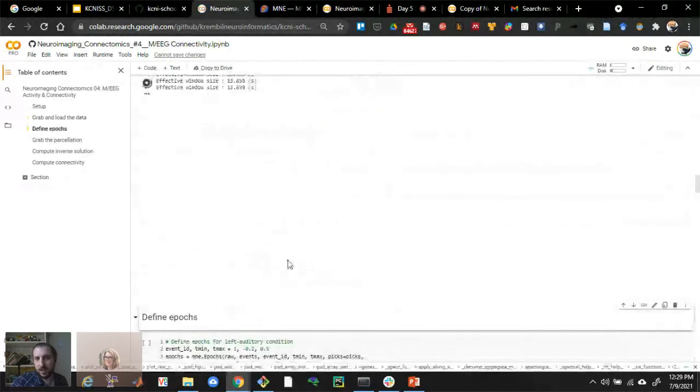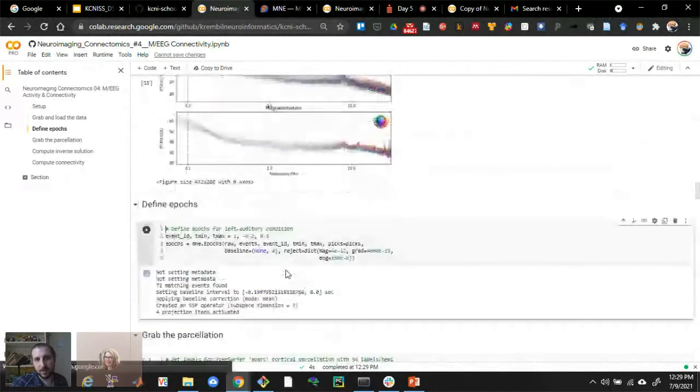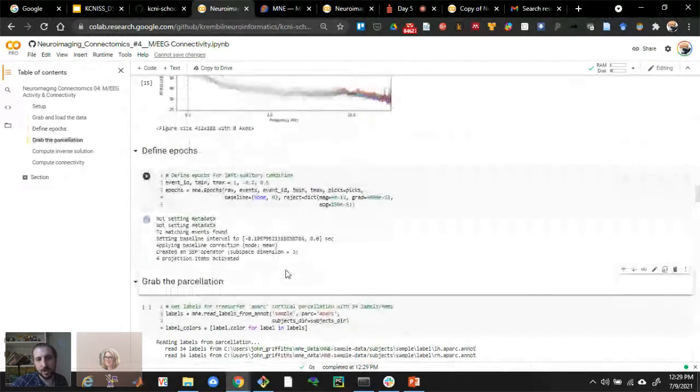So we can plot it in a log scale as well, or log on the x-axis, which emphasizes the 1/f a little bit more, because it's already logged on the y-axis. So we see the 1/f fairly clearly as this straight line here. Frank was talking about FOOF analysis. So this alpha peak here would be your FOOF Gaussian that you would fit on top of the straight 1/f background. Right, so now we're going to chunk this thing up.